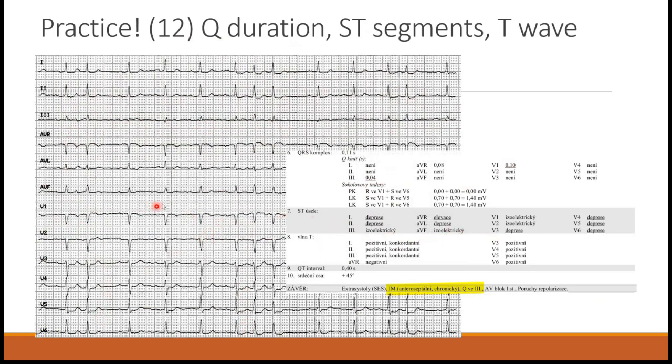And then the T waves in this are normal, QT interval you can do easily, mean electrical axis you can do easily. Now, what was my main reason for using this ECG is that now that you know that there is a prolonged Q in lead 3 and V1, well, what could it be? Well, we know if it's just a prolonged Q, not a Pardee wave, no weird T waves, then you can consider it to be a chronic MI, which is what we've written over here.